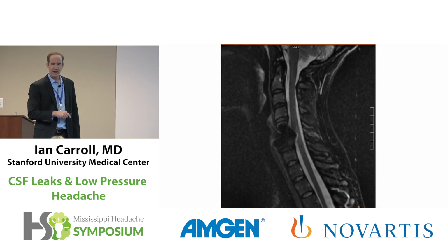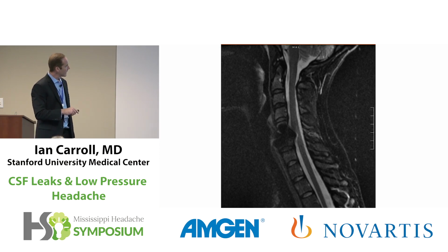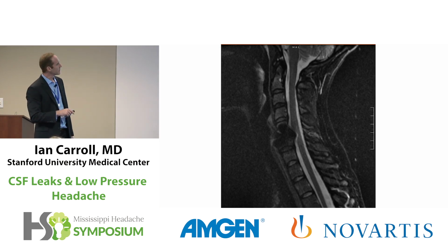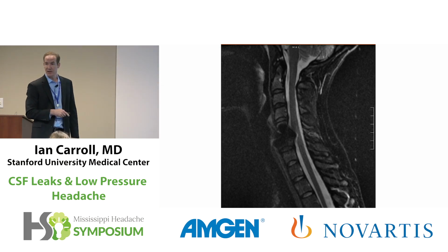Also, because of the neck pain that she had been having ever since her symptoms started, she saw a neurosurgeon who tried to help her and focused on a bulging disc in her neck and gave her a disc replacement. This looks worse than it is because this is metallic artifact bloom on the MRI. I'll show you on the myelogram what that looks like, but we were worried that maybe the leak would be up here. But I will tell you, I have seen a number of people who have had surgeons go in and try and help them by doing fusions or disc replacements because of their neck pain when the neck pain is from a leak. And you'll remember on her 48-hour flat test that the neck pain got much better when she just stayed flat, right?